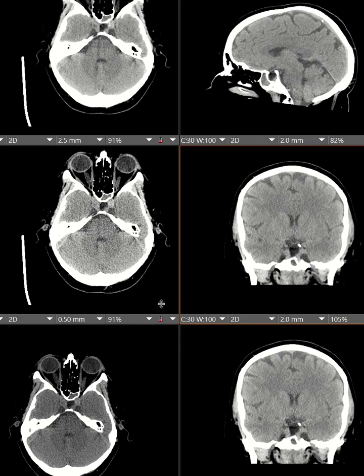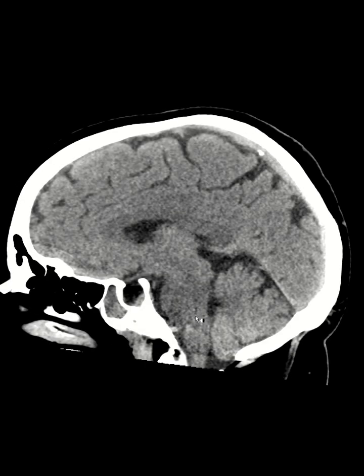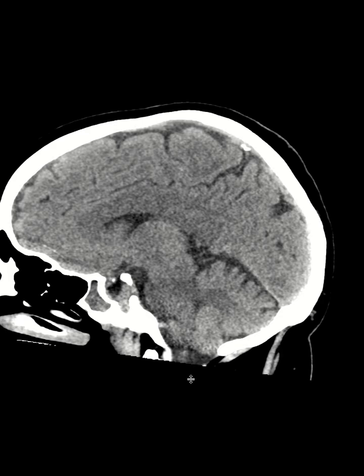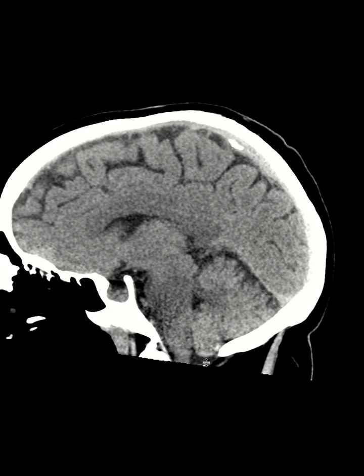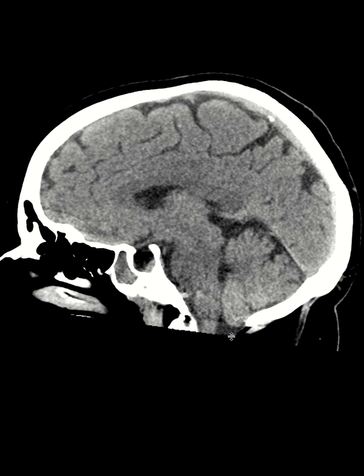Okay, let's keep looking. Then we look at our sagittal reconstruction and see again this huge partially empty sella, the sella turcica is very deepened, as you see here. If I look more closely, I see that there is some sort of cerebellar tonsillar descent as well, so it looks like there is a little bit of acquired tonsillar ectopia. If you put all these findings together, there are huge optic nerve sheath CSF spaces, a partially empty sella, cerebellar tonsillar descent, and enlarged extra-axial CSF spaces, specifically Meckel's.